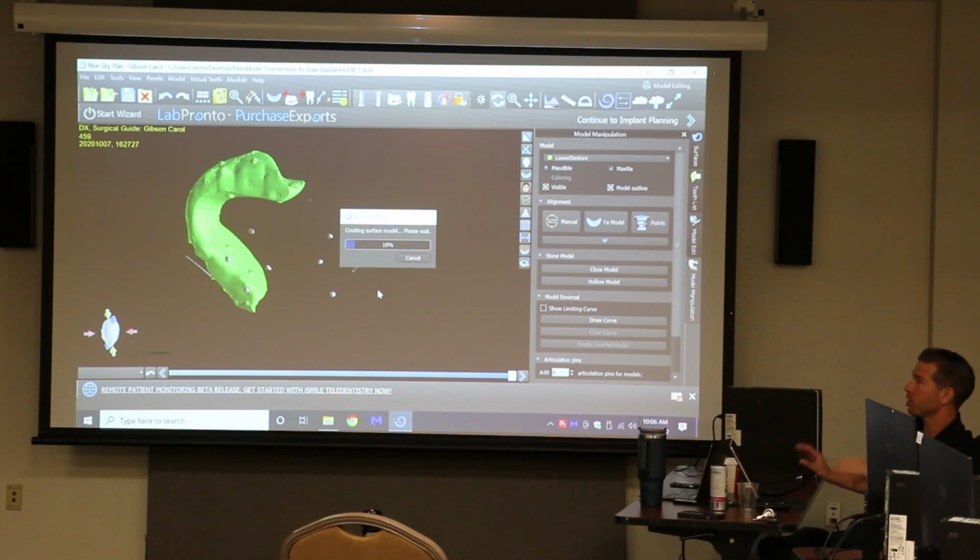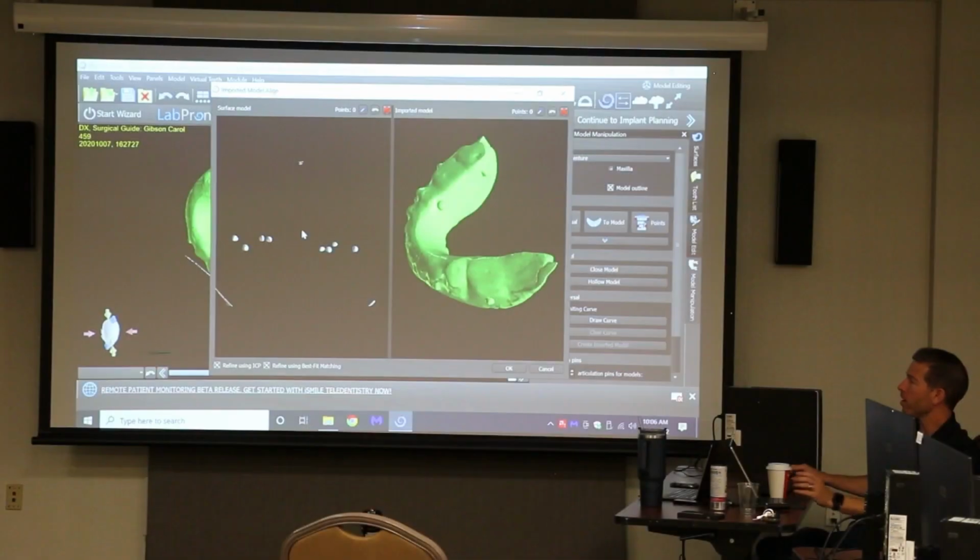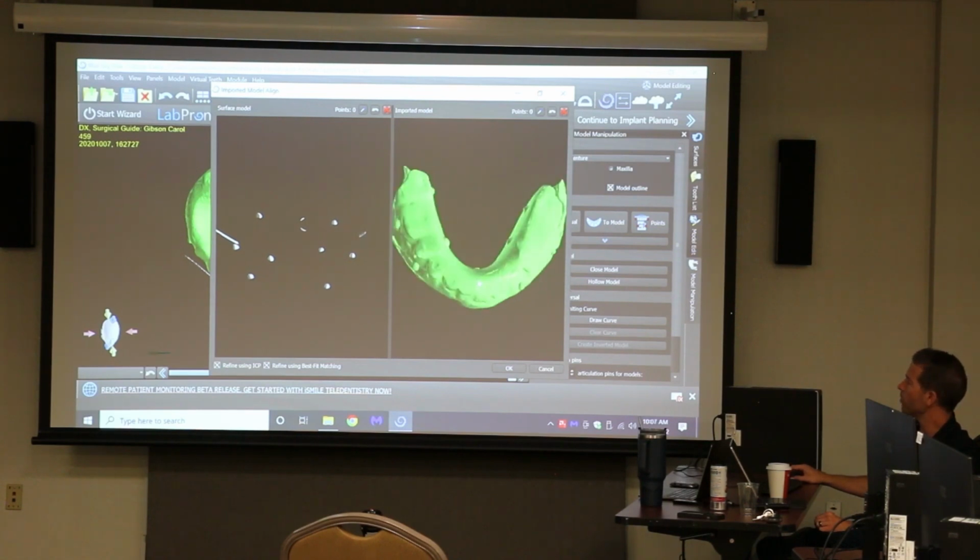And then I'm going to show you how you want to orientate them in the same view and then click your points, and you'll be pretty accurate here. So I'll show you. And what I found here is helpful is if you want to look at this in the same view, if you can get the whole thing in the same view, it's helpful.